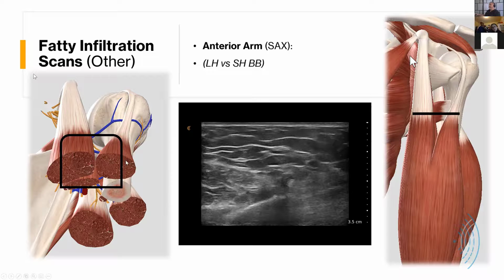And lastly, because I've already told you, but because we know that the long head of the biceps has been torn, it has retracted and given us that same snake in a pillow slip. How about that? A snake in a fabric bag. It's rolled up and wound up. That's this region right here.